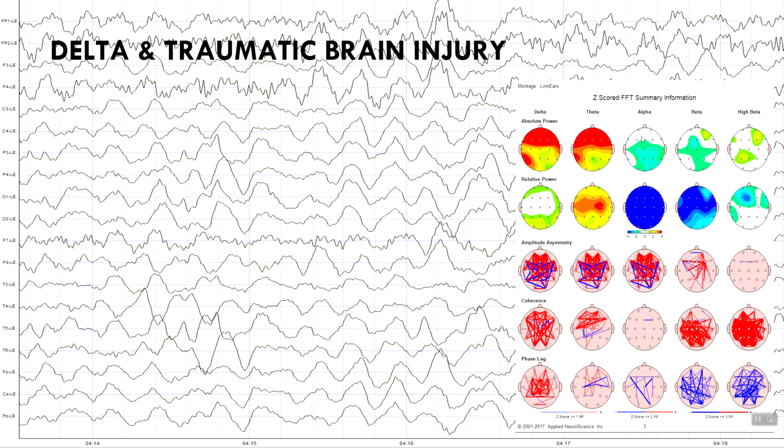And so this is the translation of the seminal text into the book, essentially, into the map, right? You can see that high amplitude delta translates to 4 standard deviations more delta frontally and in the posterior temporal lobe than we anticipate. And this kid also has some theta woven in there, right? So we know that there's delta because we count them: 1 to 4 oscillations per second.